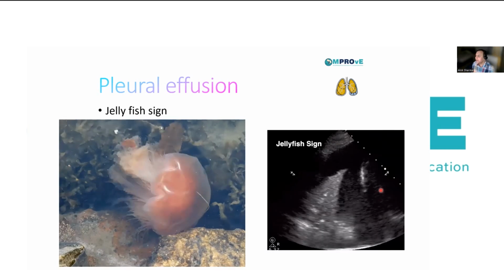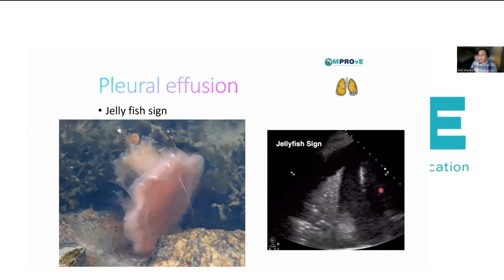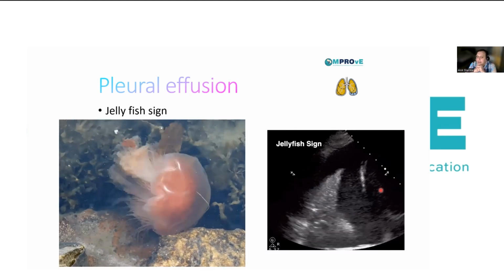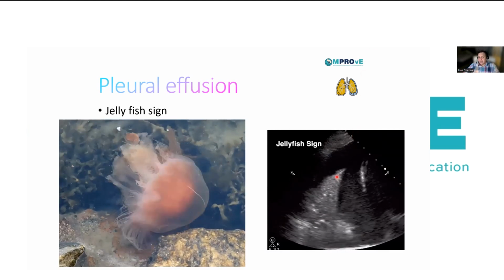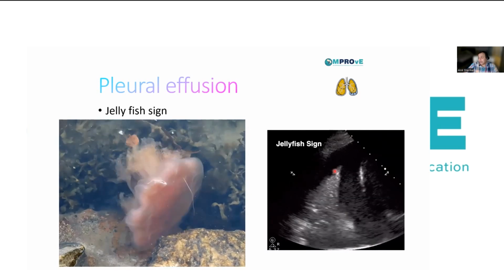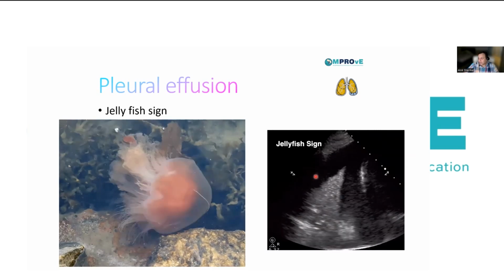What I would advise is that you must clinically correlate. I can't emphasize this enough, because with underlying lung disease there are a large number of features, as we've seen in our course over the past 3 months, which overlap. Compressive atelectasis with static air bronchograms might just be lung that's atelectatic because of fluid, as opposed to pneumonic consolidation.